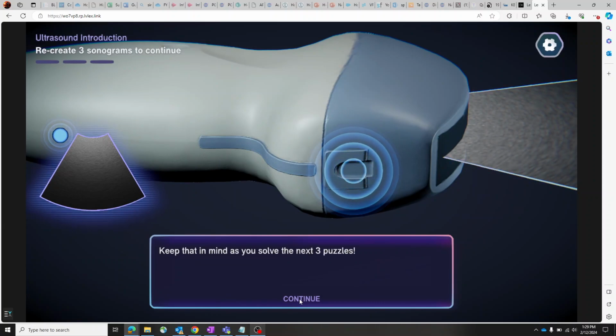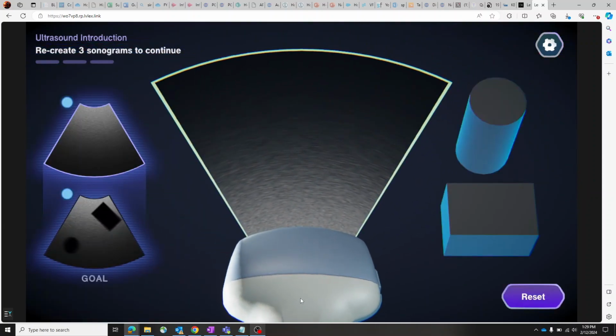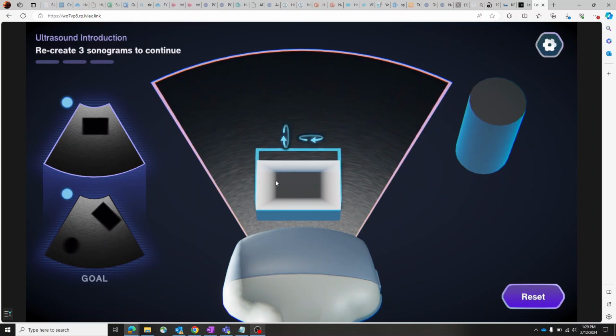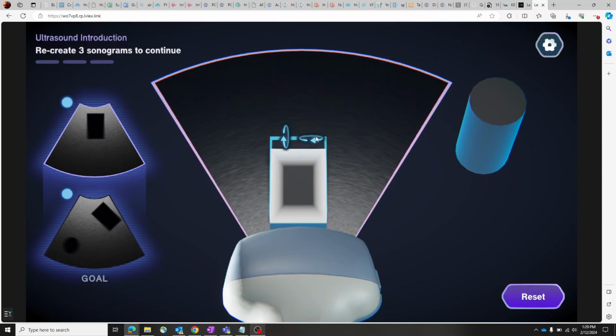An example here would be that the tail is a landmark for you to understand the orientation of it. So now that I can see the tail, oh, it's not. Yeah, and that'll be really important in the later procedure too.